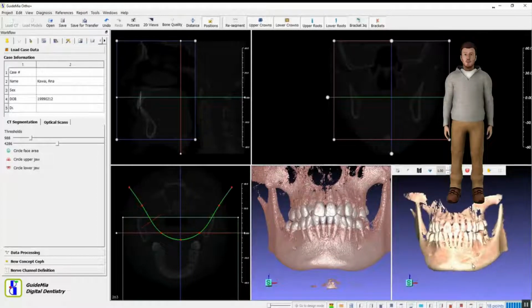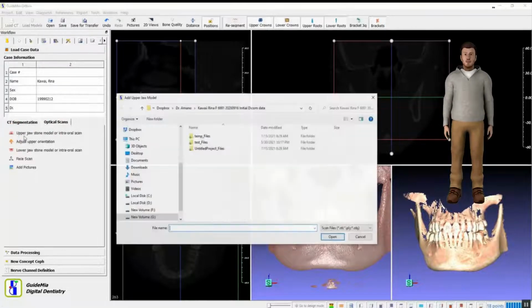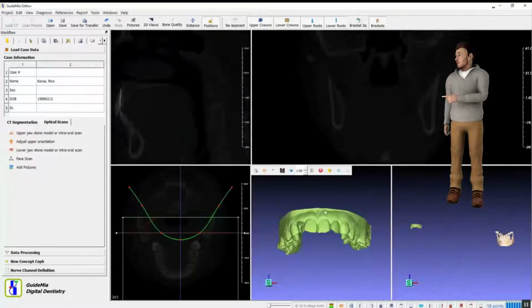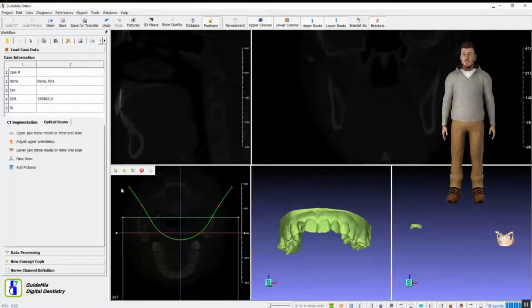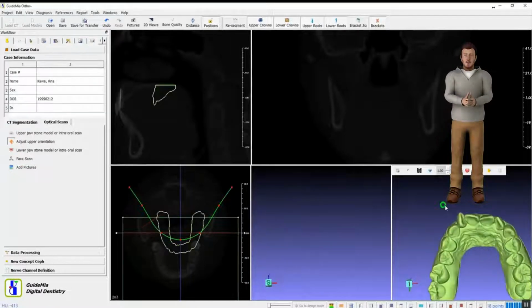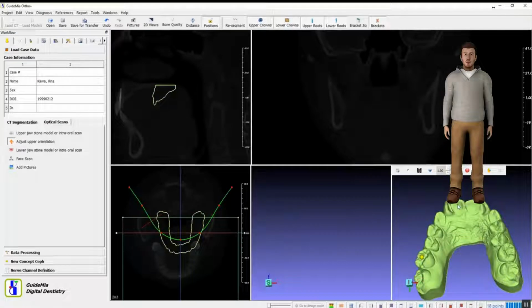Now the facial scan is in its place, and we can then load clinical pictures. The pictures can be in any image format. In this case, we load the X-ray file. For other pictures, the image viewer can be used to go back and forth to view pictures, and the individual pictures can be added to the 3D scenes too, and overlaid with 3D models. This can be useful when we want to simulate some visual effects.